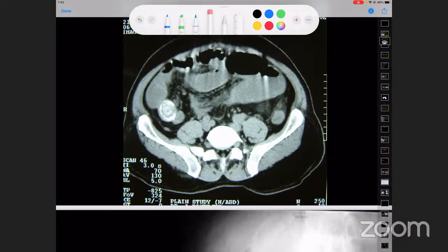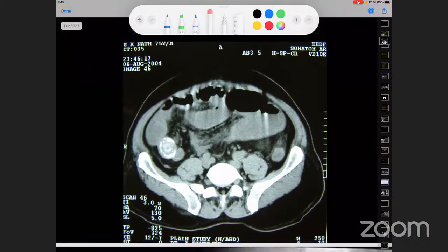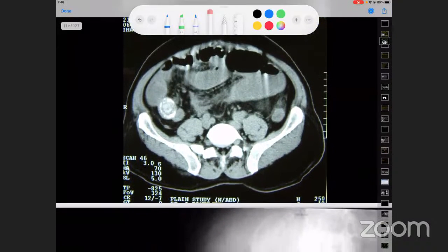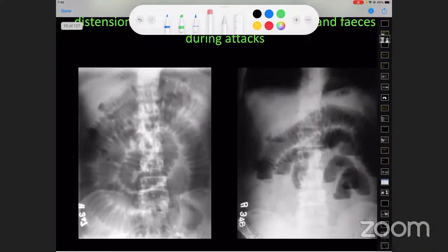This is a pretty old CT, around 10 or 15 years back, but the quality of the CT has been maintained excellently. Quick diagnosis, Avik? Just before that, I would want to see the X-ray.